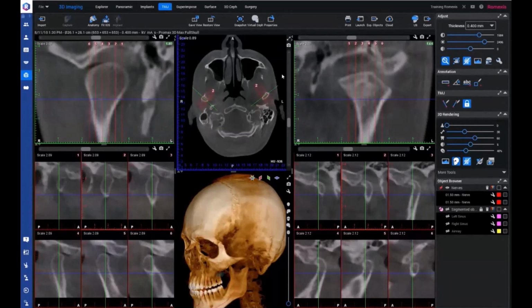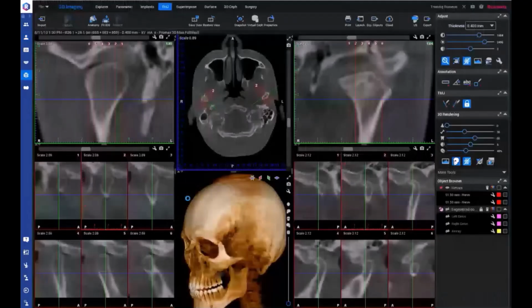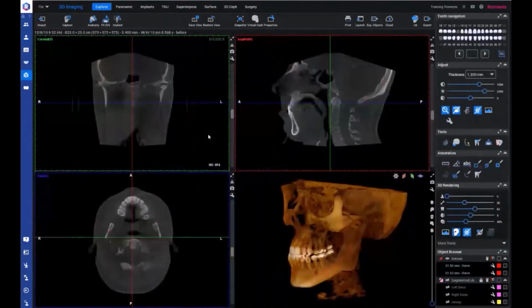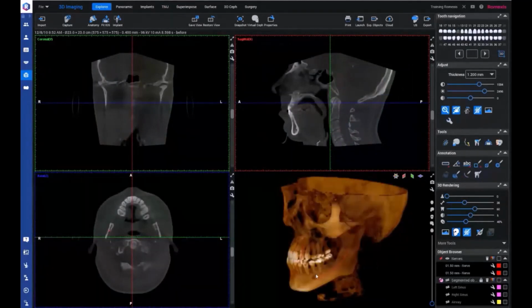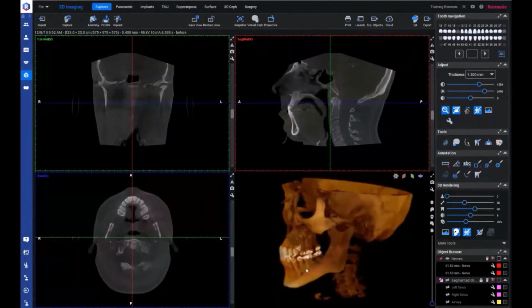Okay, let's then jump to another volume. I will open up this. We will see the last, well, not the last one, but the superimpose module that we have here. So for that, I need to have some patient that we have before and after volume for. So we have here a patient. We have the volume from before.